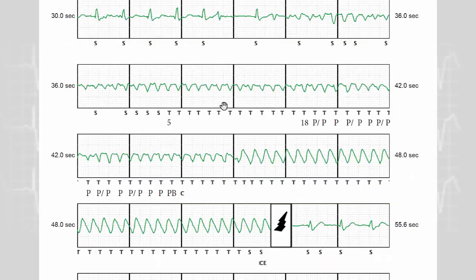So this is still the same patient and with now an episode of sustained ventricular arrhythmia, and you can see that before the charge, the smart charge has delayed the onset of charge by 15 cycles of persistence, so around 1, 2, 3 seconds before the onset of the charging.